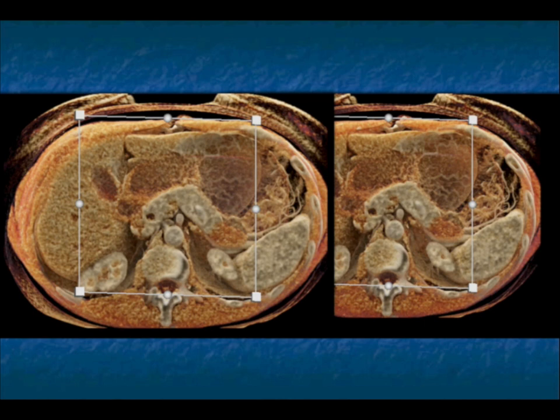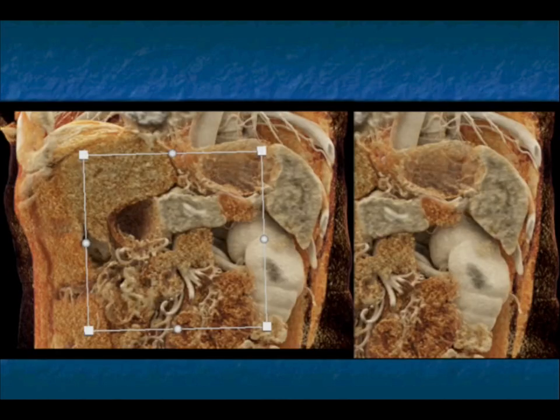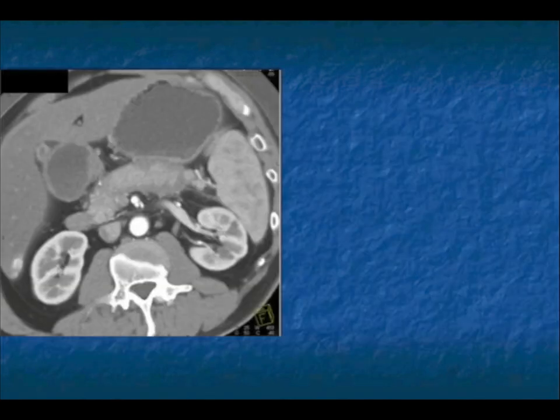And again, the cinematic rendering really accentuates the tissue changes through a range of different views and perspectives. But one has to admit it's very hard not to say, I'm concerned for pancreatic cancer. And again, how do you treat autoimmune pancreatitis? Two weeks of steroids. If you're not certain, if the lab values don't work, but it still matches, give steroids, 50 milligrams a day for 14 days. The pancreas will shrink, the mass will disappear.